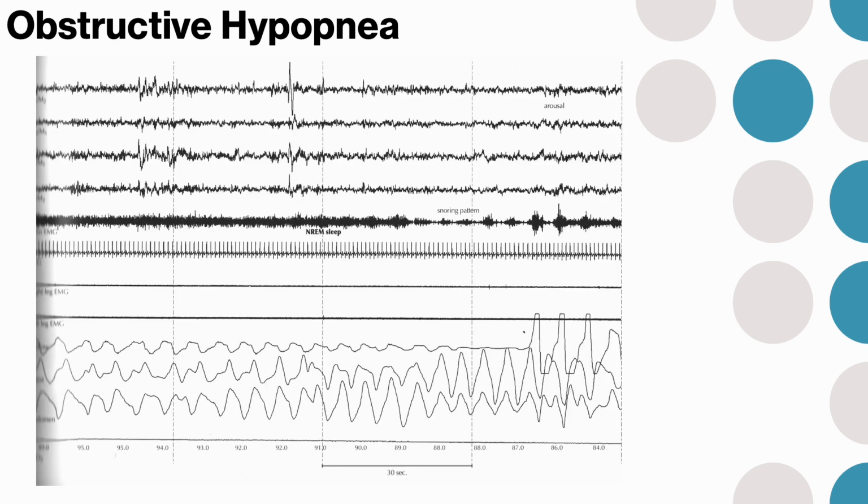This is a great example of flow limitations. Sometimes the nasal pressure signal just looks strange, or it might even have cardioballistic artifact from the heartbeat that actually pulses through the cannula when you put it on too tight. So that would be a normal flow, especially if they're not arousing or having any events. Otherwise, you might get something that looks like this, and this is flow limitation.